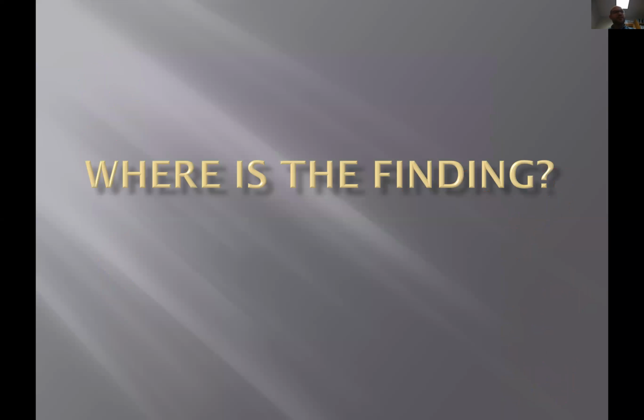All right, next case. Where is the finding? Now, this one is a detection case. Really hard. Just a reminder of how you do detection. I don't want to insult anybody here, but I told my students that discipline is how you do detection. You've got to be disciplined.